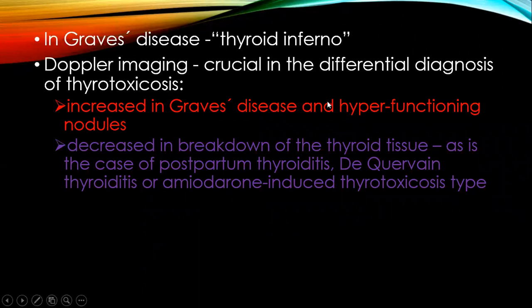So Doppler imaging is very crucial in differentiating causes of thyrotoxicosis. As we said, perfusion is increased in Graves' disease and hyperfunctioning nodules, and it is decreased in settings of breakdown of thyroid tissue, as in postpartum thyroiditis, subacute thyroiditis, or amiodarone-induced thyrotoxicosis.